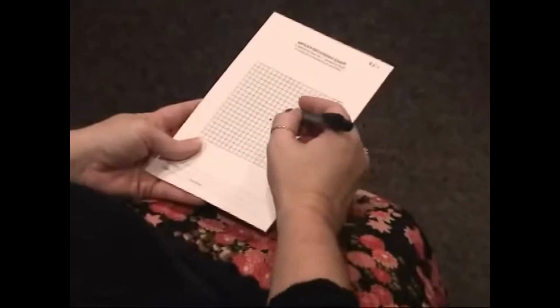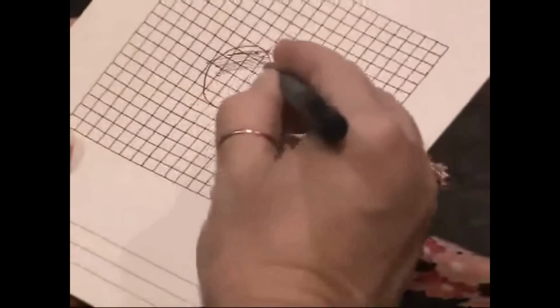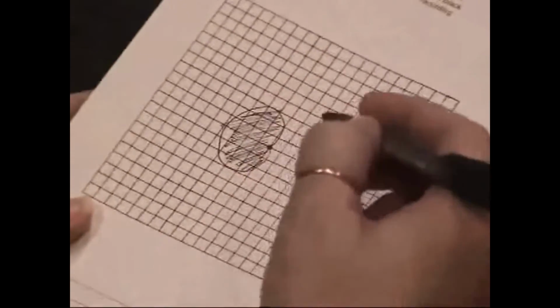In the Amsler grid test, patients draw their own visual field defects. It assesses only the central 10 degrees of the visual field, and patients must be aware enough of their defects to draw them. The other informal visual field test is finger confrontation. This test is limited to detecting dense and large hemianopic and altitudinal defects.